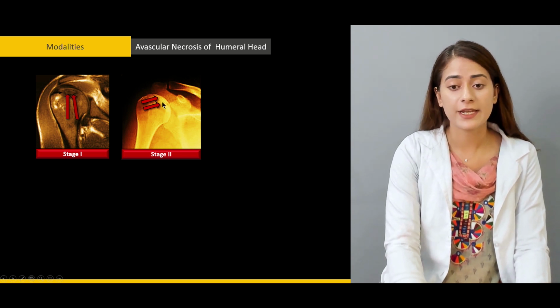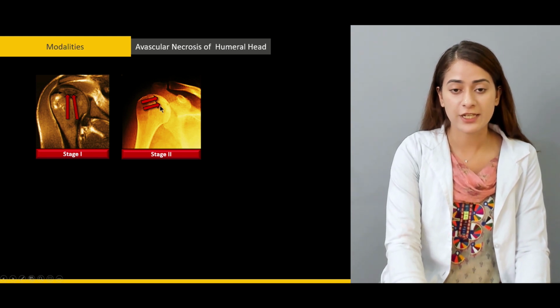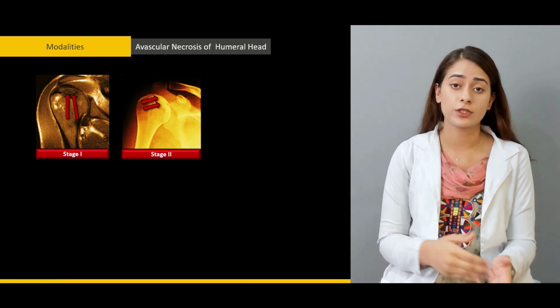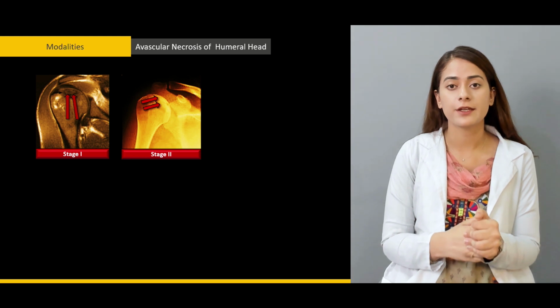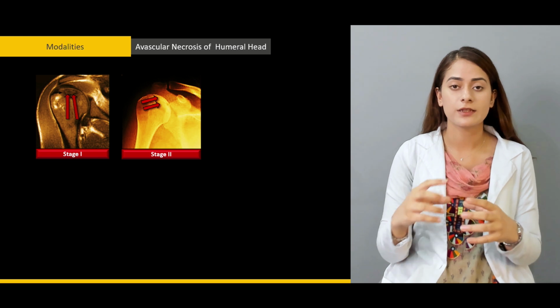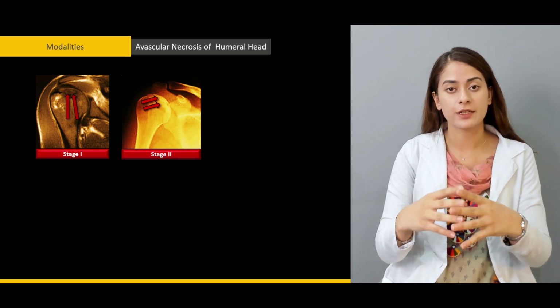Then this is an X-ray showing a more opaque presentation here. This is because of the increase in osteoblastic activity, the increase in bone formation cells at the site where there is decrease in blood supply, and the tissues are dying.